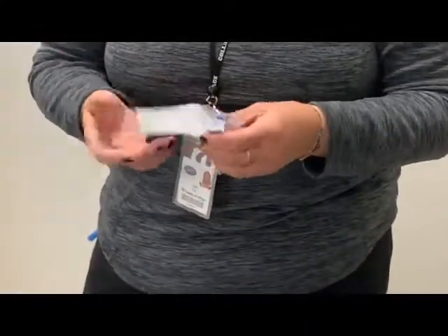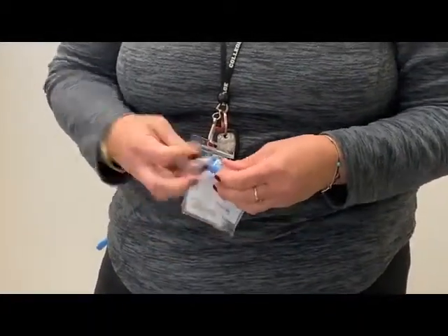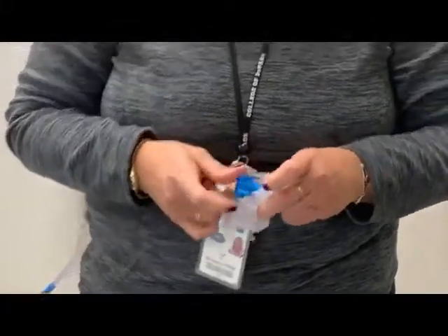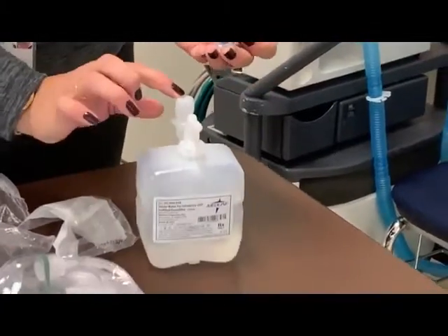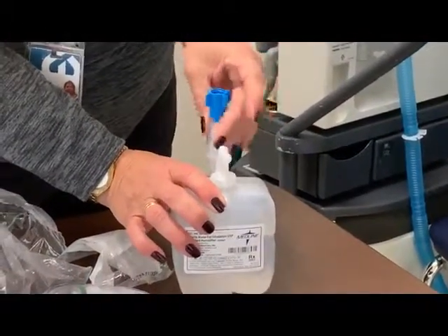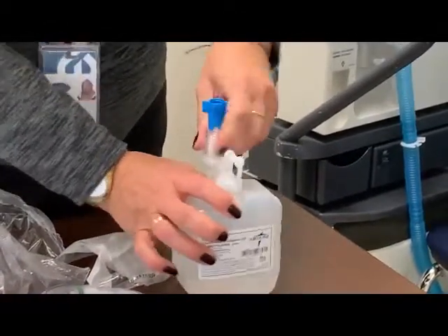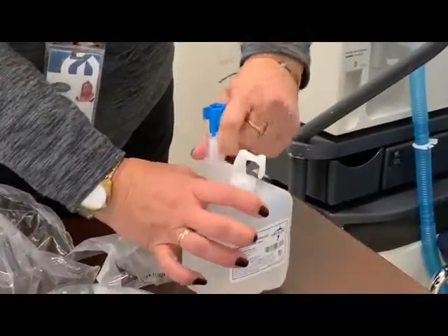The 2 pieces of equipment that come in here are going to be the actual water source itself, which is sterile water for inhalation, and then this is just the top of your connection that will hook up into the flow meter. I'm going to go ahead and set this up. This is just going to twist on the top. There's a puncture point that's going to puncture through the top of the bottle. Just twist on like that. You want it snug, but you don't want to over twist it.